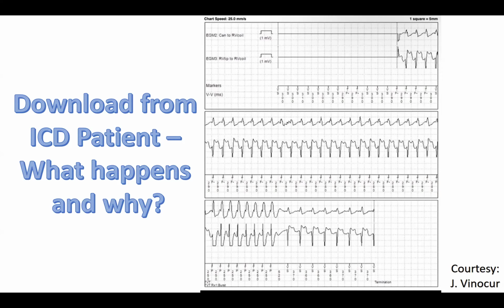Oh, okay. And so what we're seeing here, I think, is that the patient might be in sinus tach, a little over around 200, and the device actually starts pacing, and then it terminates it. But I guess it's probably VT, because why would sinus tach terminate with rapid V pacing? Yeah. But what it does is it paces faster and faster. You see here the cycle length is 250, and then it breaks.